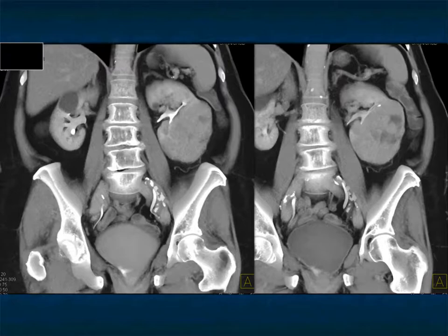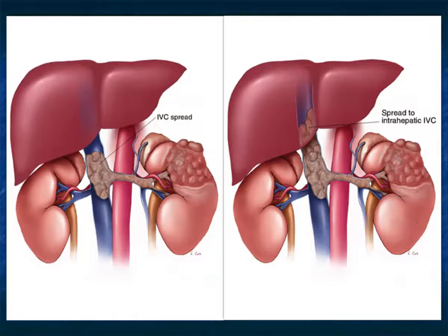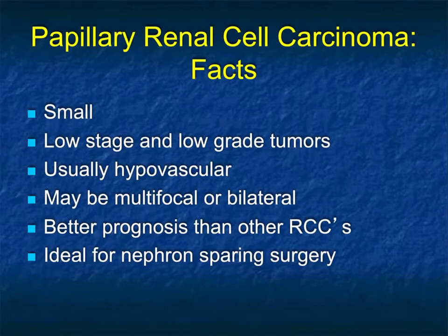So you can see exactly how each of the various phases becomes helpful, but the diagnosis of renal cell is fairly easy. And again, it's one of the common causes of hematuria. We spoke before about renal vein involvement. When you stage patients with renal cell, we'll be looking carefully at the extension into the renal vein and perhaps extension in the IVC and how far that extension goes.